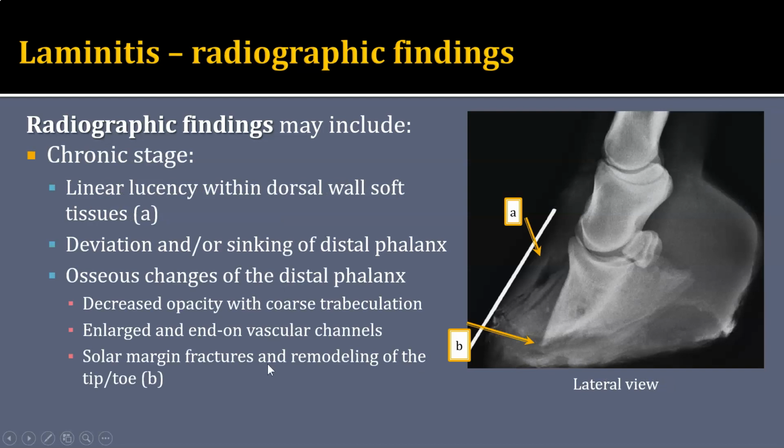There are a lot more changes that we can see and identify radiographically when we have moved into the chronic phase. And certainly distal phalanx displacement is definitive evidence of the chronic phase of laminitis, and that's going to be our mechanical separation of dermal and epidermal laminae.